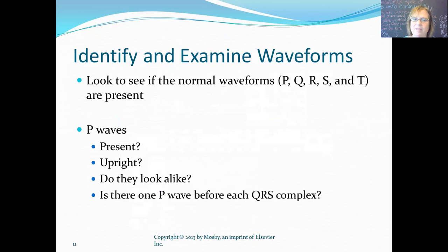And is there one P wave before each QRS? Just one P wave before each QRS. Okay, that's what we're going to do with our P waves.